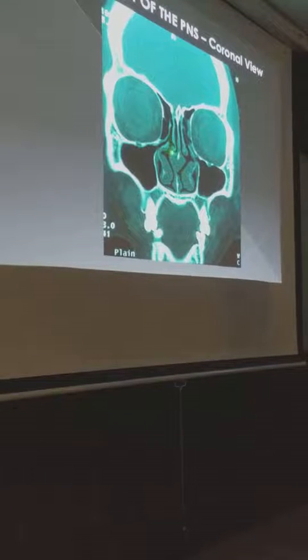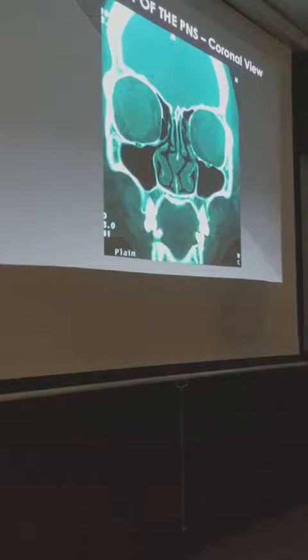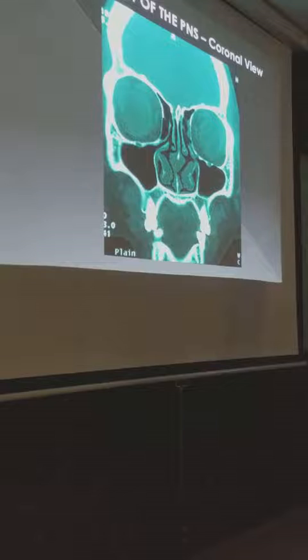So in other words, if your access to the infundibulum, a three-dimensional space, is through the inferioris, your access to a three-dimensional space, which is the sinus lateralis, is through the hiatus semilunaris superioris. Is that clear? Okay, next slide.